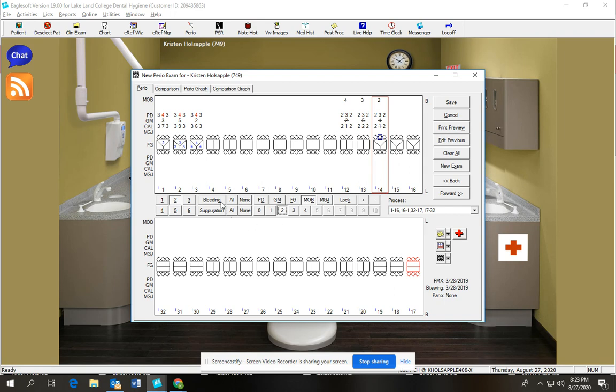Okay, so bleeding. Each tooth has 6 surfaces. All right, so keep that in mind. When I was doing a charting earlier, I had removed a tooth from the chart, and so that's why this one's red. So we'll just pretend that one's black and that it's still there, but that was an accident from earlier.